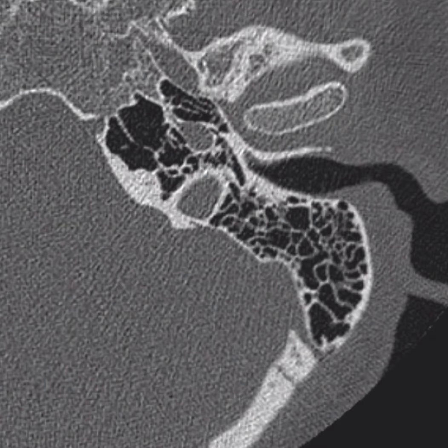Here on axial CT, through the temporal bone, we see the external auditory canal right here, narrowing slightly at the isthmus as we transition from fibrocartilage to bone. The bony portion of the external auditory canal is formed largely by the tympanic segment of the temporal bone, which forms its anterior, inferior, and posterior walls. The superior wall will be formed by the squamosal portion of the temporal bone.